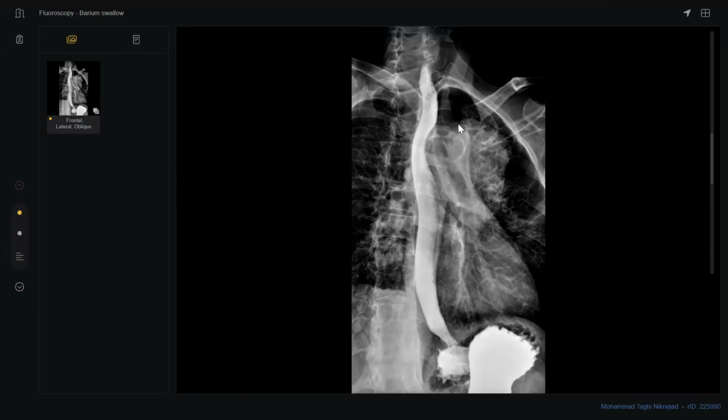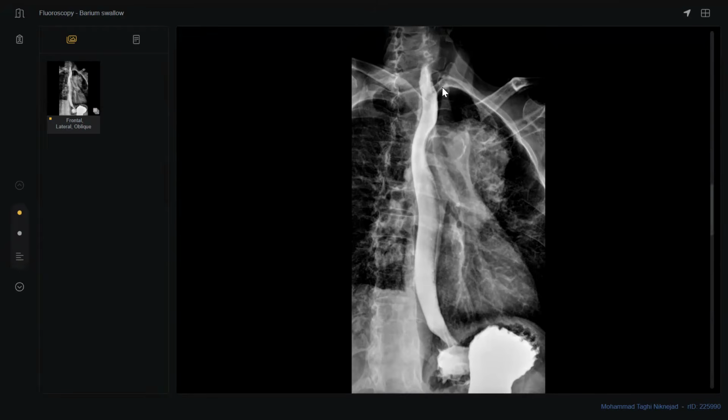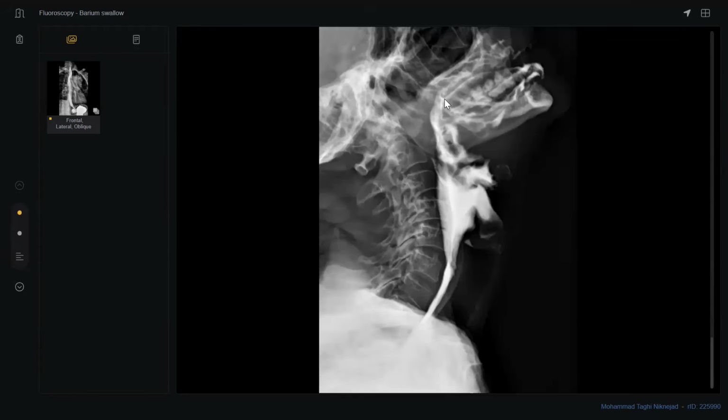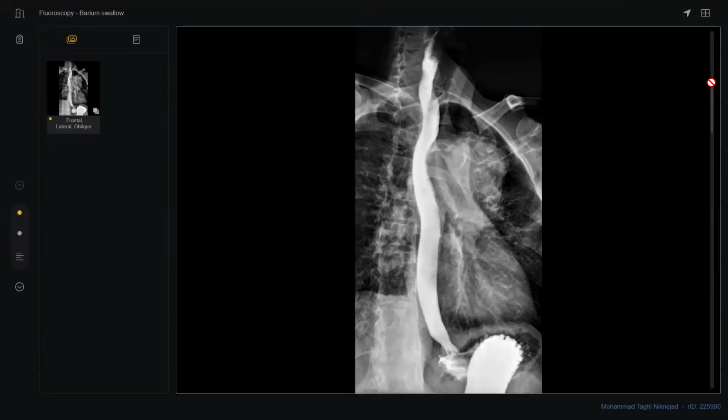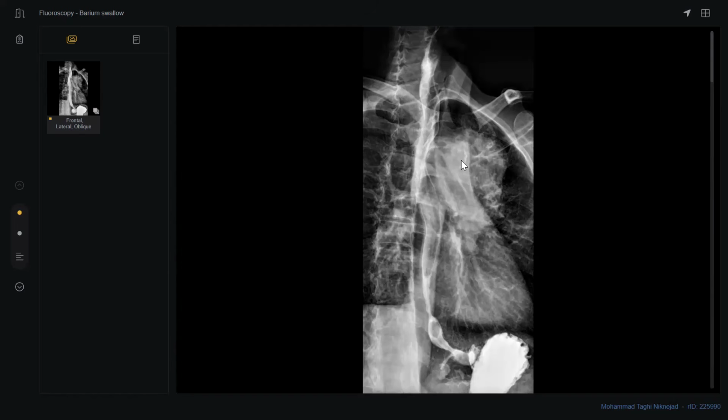Okay, so I've been presented with one of the images of the barium swallow study. These are scrollable images, so I've been just going through the images first. They are not scrolling, sir. I'm trying to. Images are not... By the arrow, use the arrow. Oops. Yes.